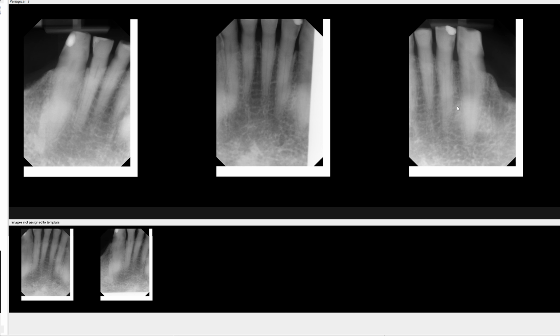And if you look over to your left, or the patient's left, it's not as clear, but you can see there's a diffuse radiopacity here. Also, looking to the patient's right side, this opacity is seen here, but again, not as clear in terms of its border. If you look below, these are some other radiographs that were taken but not ended up being mounted, but you can see again the opacities that I previously addressed.